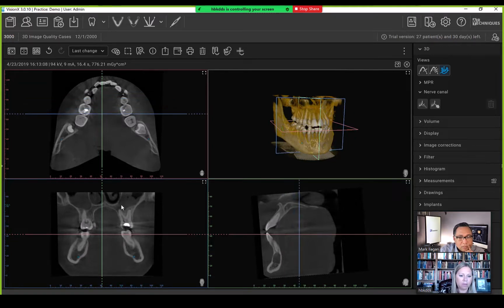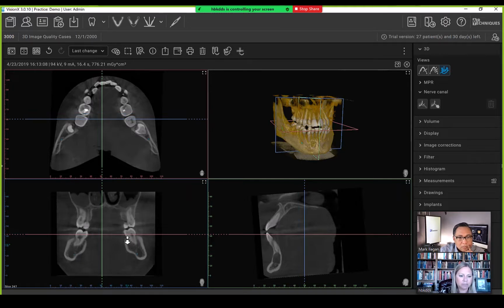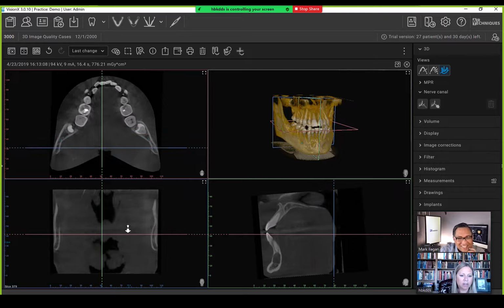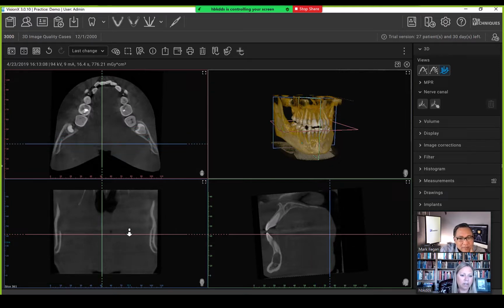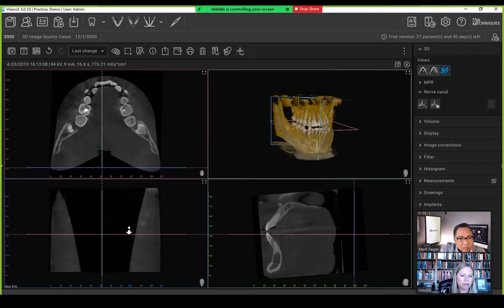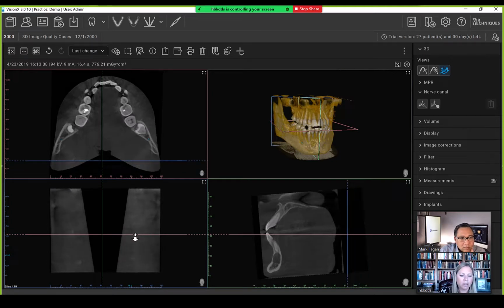Moving back, I want to make sure cortical borders, we already talked about tooth number 14. I'm making sure the palate is nice and intact. Lateral aspect of the nasal fossa, maxillary sinuses. And all the way back, oh, cute little third molars, but making sure everything looks good. And we have our medial and our lateral pterygoid plates. You can see that right here very nicely, medial and lateral, and all the way back. All right, then I'm going to come forward.